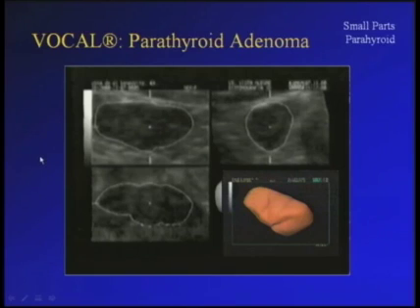Another example of 3D ultrasound, this is an image corresponding to the VOCAL technique, virtual organ computer-aided analysis. This is a parathyroid adenoma of only 9 millimeters longitudinal measurement. And here we have the reconstruction, the volumetric reconstruction, and the computer offers an automatic calculation of the volume.